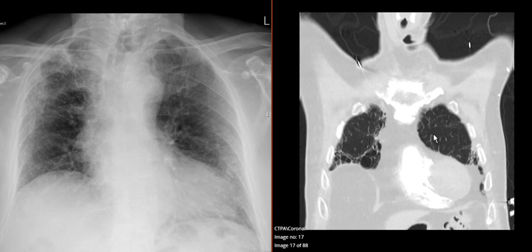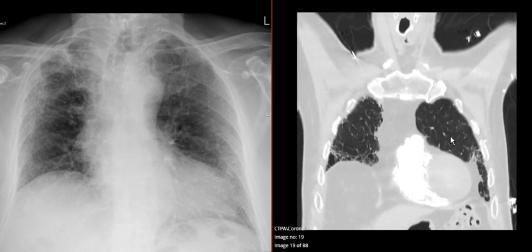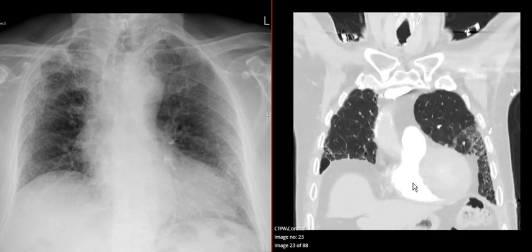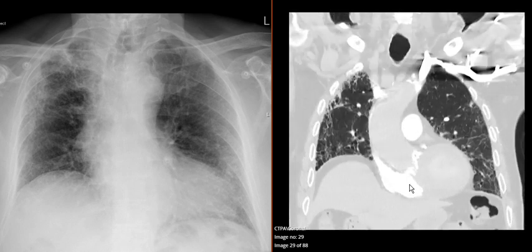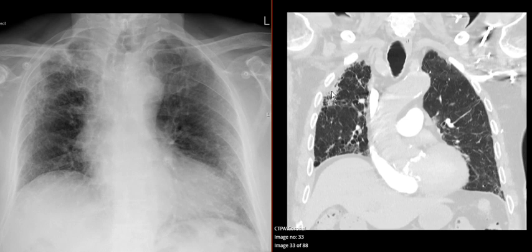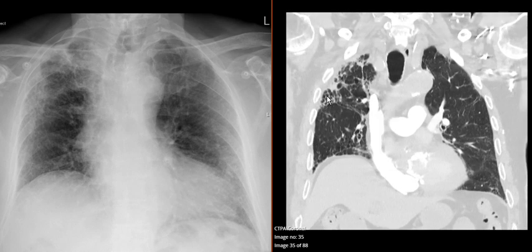So emphysema type changes in that the lung is too black, and they're holes like this rather than fine lung tissue. As we get further down, there's contrast in this for a CT-PA, CT looking at the pulmonary arteries. So that would be the right atria, sorry, the right ventricle. And again, walls and voids, fibrotic changes. This is kind of, call it an aero bar kind of look, but this holes and structural changes. And then this is like walls and voids of COPD type stuff.